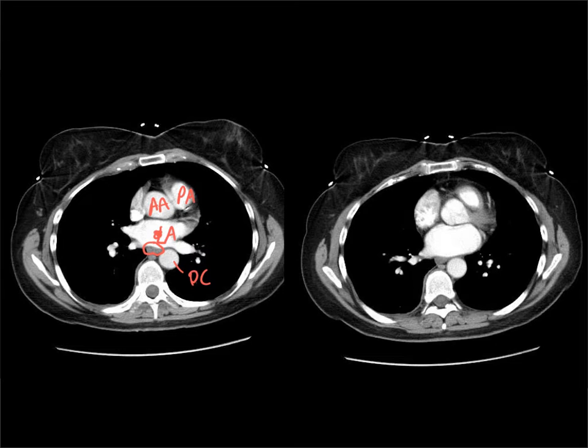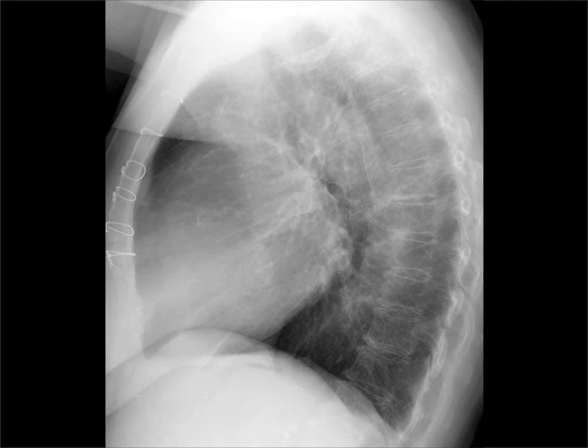And this is just a slice a little bit lower down on the right. So this patient has a big right ventricle. Look how that takes up way more than 30% of that distance. And they have a big left atrium, but they don't actually have a particularly big left ventricle. So if you remember your cardiology, this is a patient who has mitral valve disease. In this case, it was rheumatic valve disease.